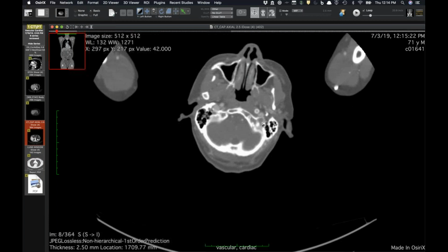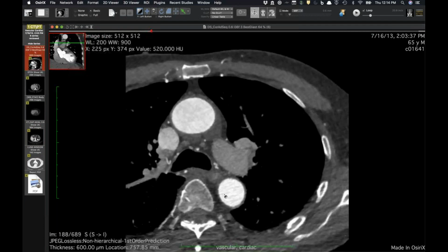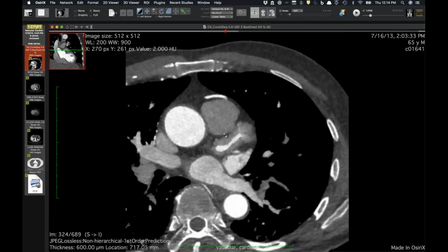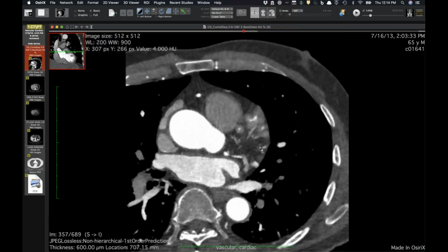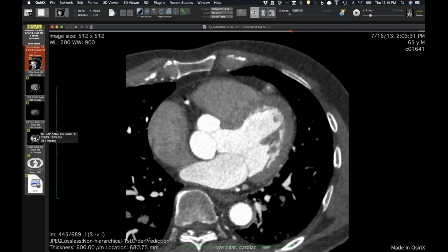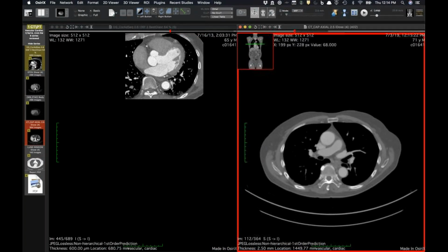But the kicker of this was what I will show you now, which is his coronary arteries, and in particular his left anterior descending coronary artery. And he's had this since 2013, but you can see this, oh my goodness, soft tissue extending along the entirety of his LAD and his diags and his septal perforators here. So this was 2013. Now he's been treated with immunosuppression off and on. 2019, here I've got a PET CT from just last week, which is how I found this case.